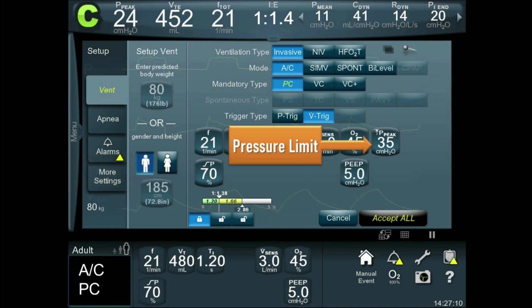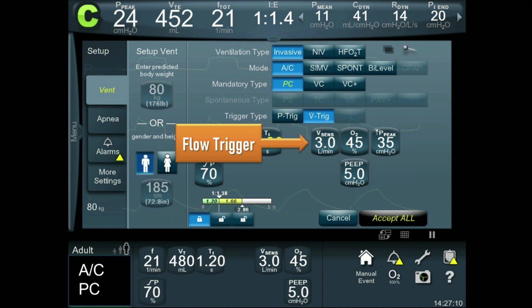You should always set a peak pressure limit. This is important because if the patient starts to cough, you really don't want to be double breathing for the patient. So the ventilator should cycle off to expiration, and that's 35 in this particular setting. And here's how we're deciding to trigger this particular ventilator, using flow-by triggering that I explained in one of the early tutorials.